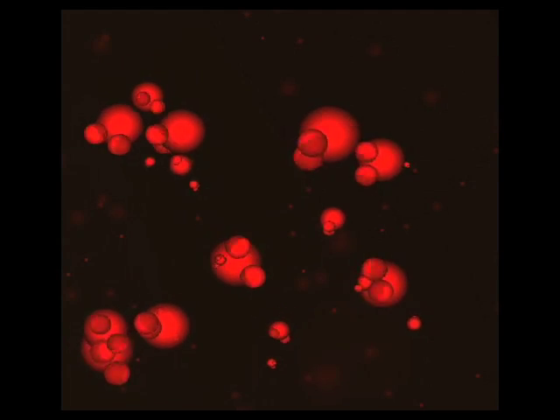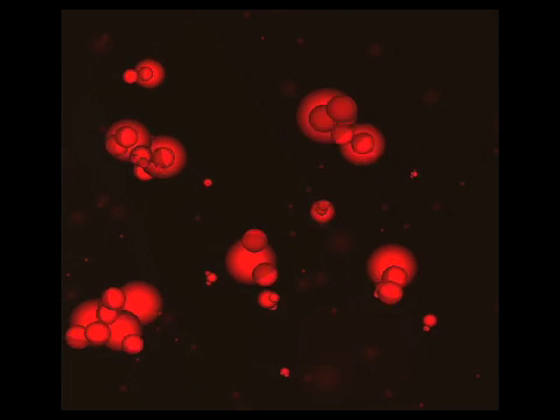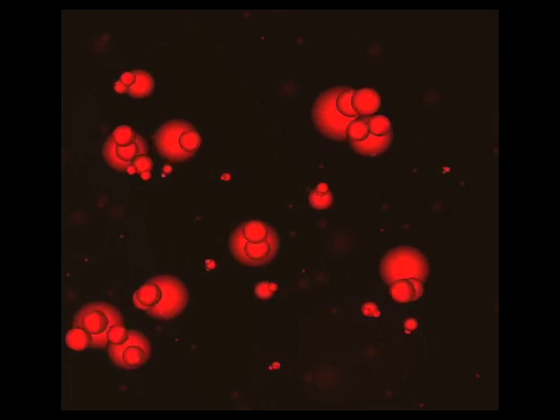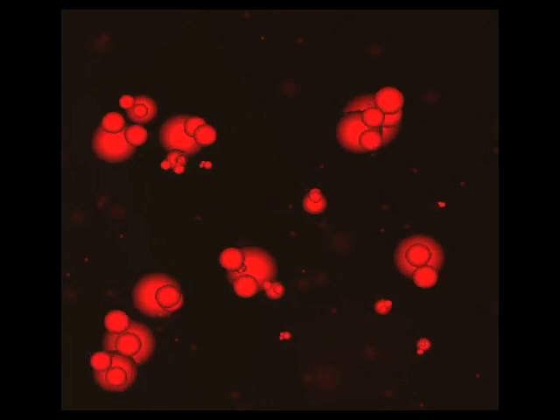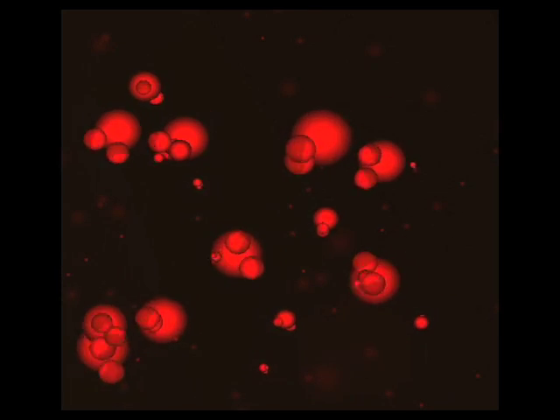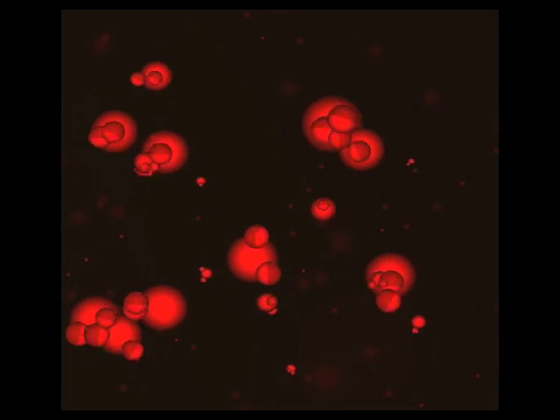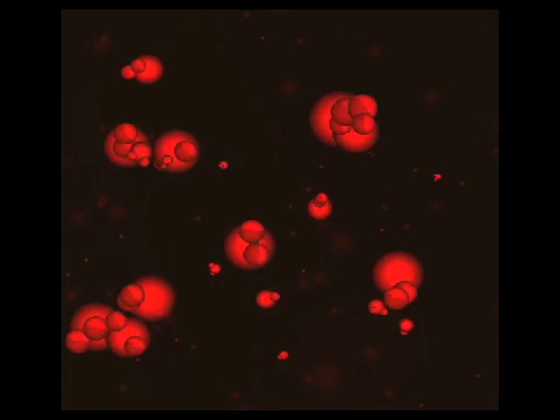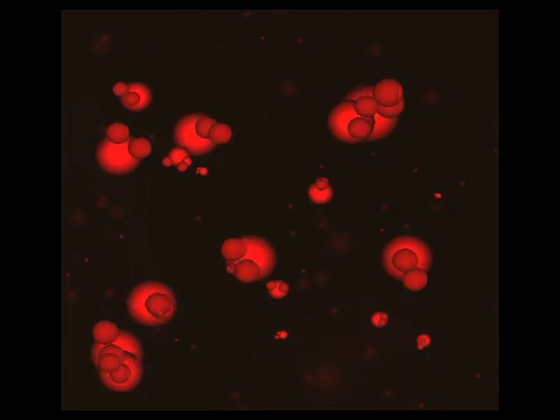This slide reminds us that the MRI signal, the grayscale that we see on our pictures, comes from the magnetic moments that sit on the protons, that sit on the hydrogen atoms, that sit on the water molecules that fill our human tissues. And you can see that these water molecules are dancing around, translating, rotating rapidly, vibrating, and it's altogether this rich environment that encodes the information about the local environment, and this is what gives us the grayscale that we see in our pictures.